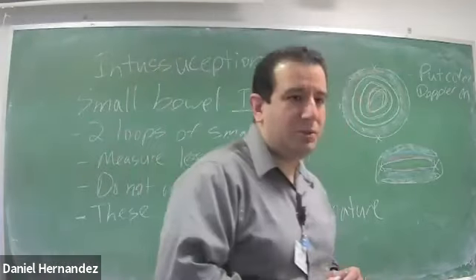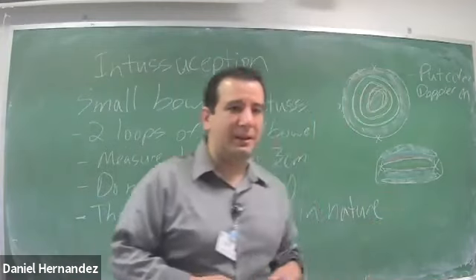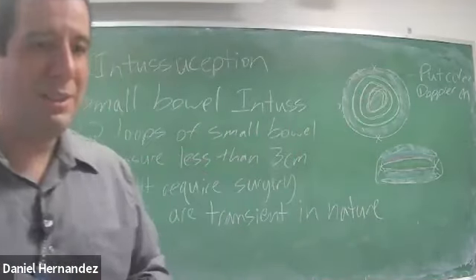So some of the literature describes this long axis view as a pseudo kidney or sandwich sign.